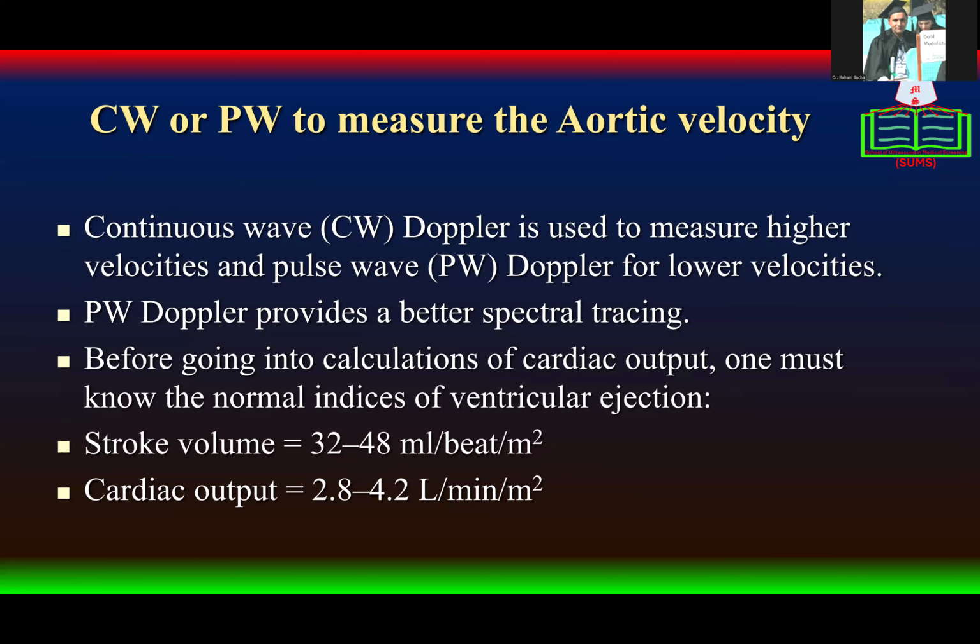But with pulse wave Doppler, we can have aliasing with the spectral waveform. So for that purpose, continuous wave Doppler was used. Pulse wave Doppler provides a better spectral tracing. That's why it will be used.